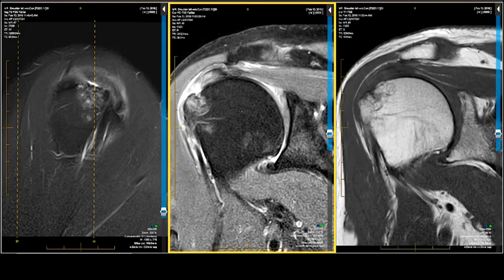So we're going to determine whether our abnormality is old or new. If you're not sure, then a good out is subacute, intermediate age, right? You can't be wrong with that. If it's subacute, you're close to chronic and you're close to acute. So there are some get-out-of-jail-free cards that you can use. But this one is at least actively inflamed.